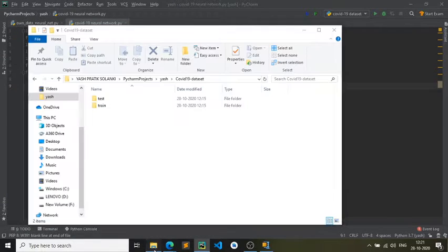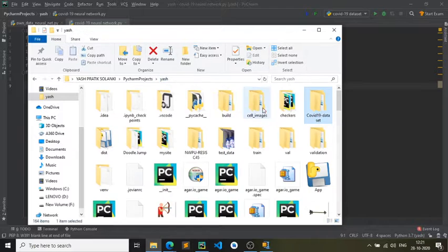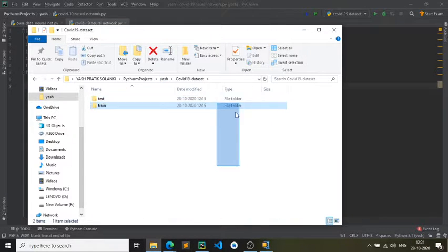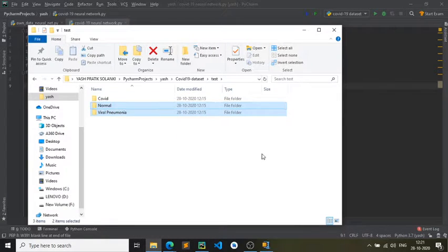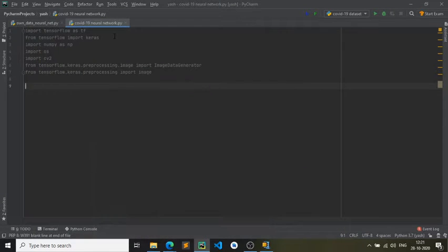Normally, the neural networks that I've created till now on this channel use either Keras datasets or TensorFlow datasets. So all of the neural networks that I've created till now did not require any loading in, we just did it in 2 lines. But on the other hand, the data that we are using currently is the COVID-19 dataset, and that dataset is not a part of the TensorFlow datasets. It's one that we need to manually download and use. So it becomes a little bit difficult for us to do it.